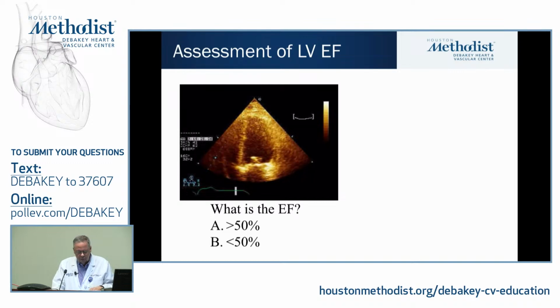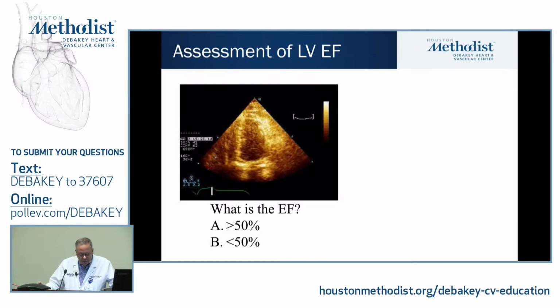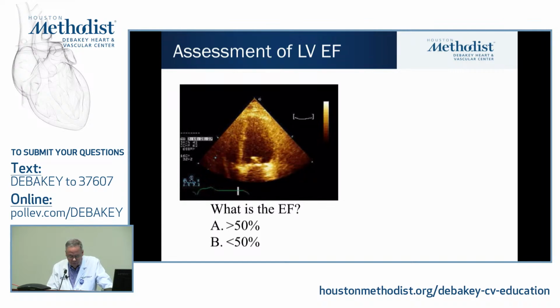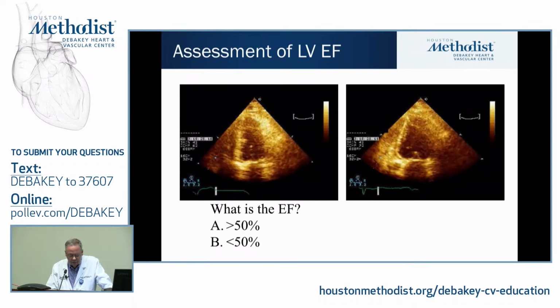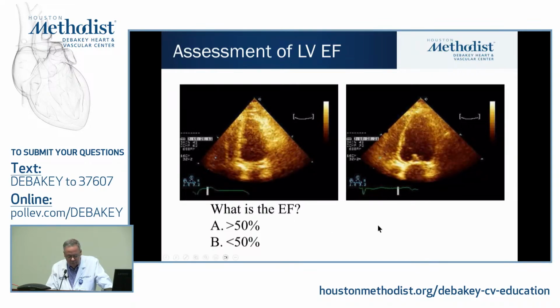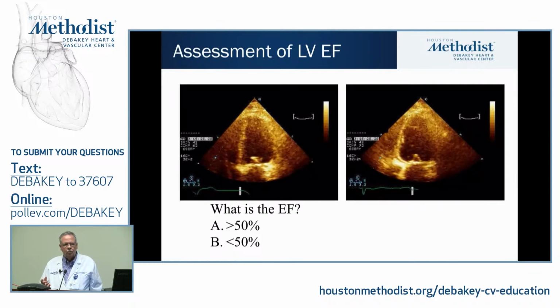I think I've shown you this slide many times before. If we look at this heart, what is the EF? I think most of us would say, well, it looks like it's at least 50, if not better. It's contracting, the area change looks good. However, right there, I think most of us would say, that's a bad EF. And it's the same heart. You can see the EKG, same EKG, and they were done basically a few seconds apart by replacing the transducer.